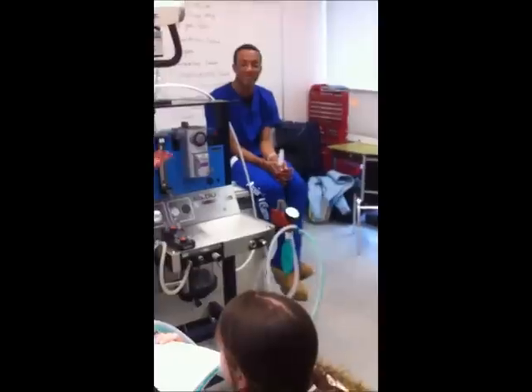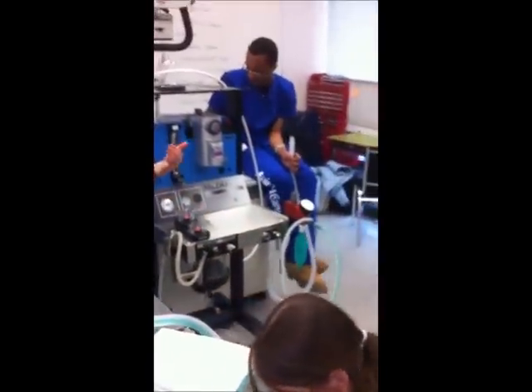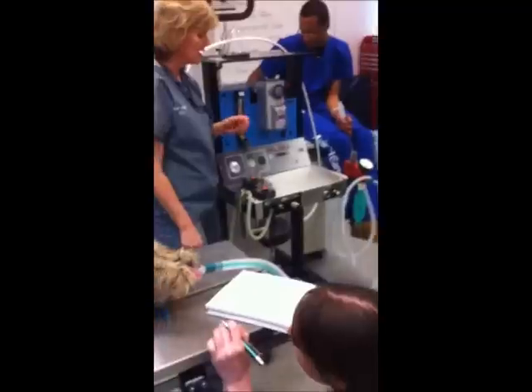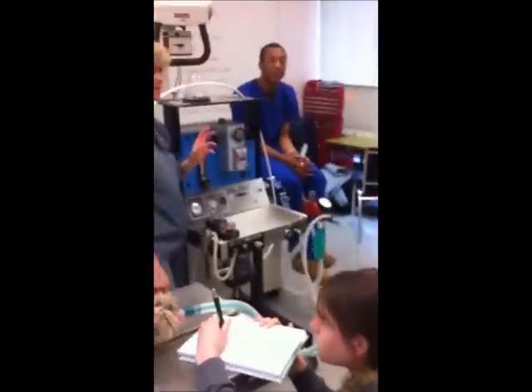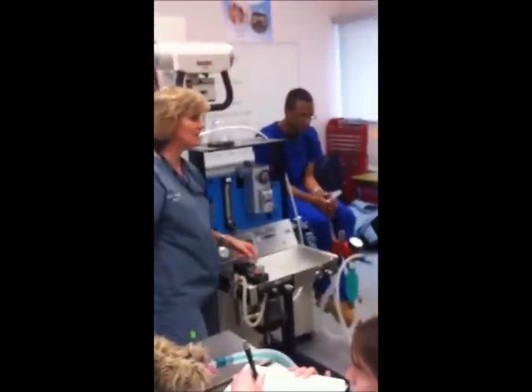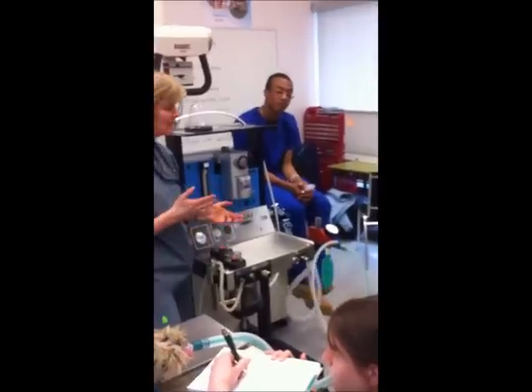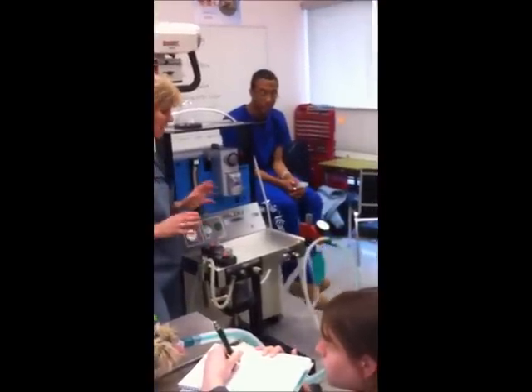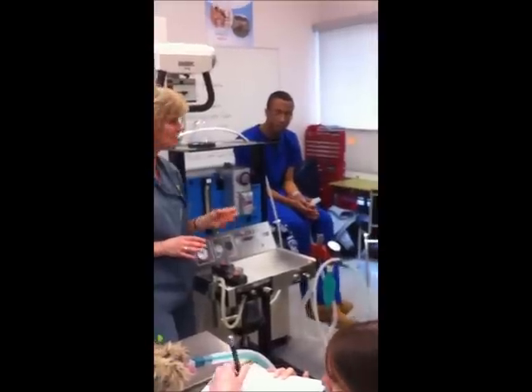So what cats do sometimes, for whatever reason, likely to do with the anesthetic drugs that we're giving them beforehand, sometimes they won't hold their breath, but they don't take just nice normal breaths. Well, if they're not breathing in what I'm sending to them anesthetic-wise, they're not going to get anesthetized. Because that whole act of breathing is what gets them there. So I may need to then bag the animal just to force some of my anesthetic into those lungs.